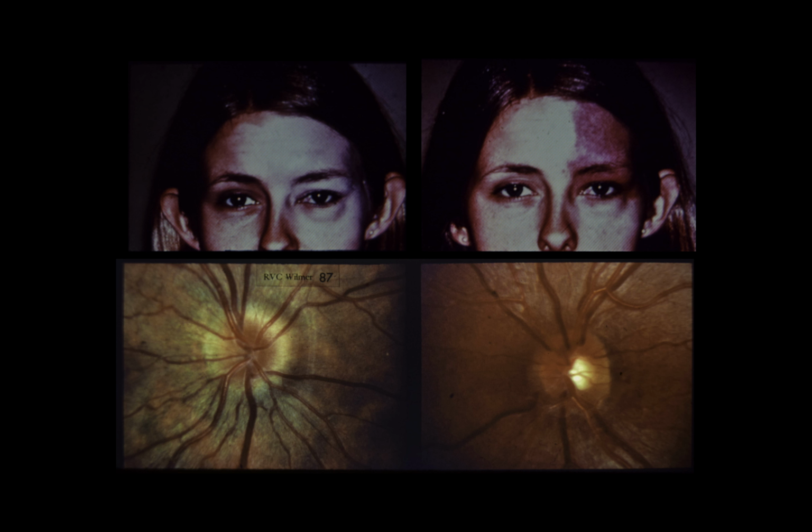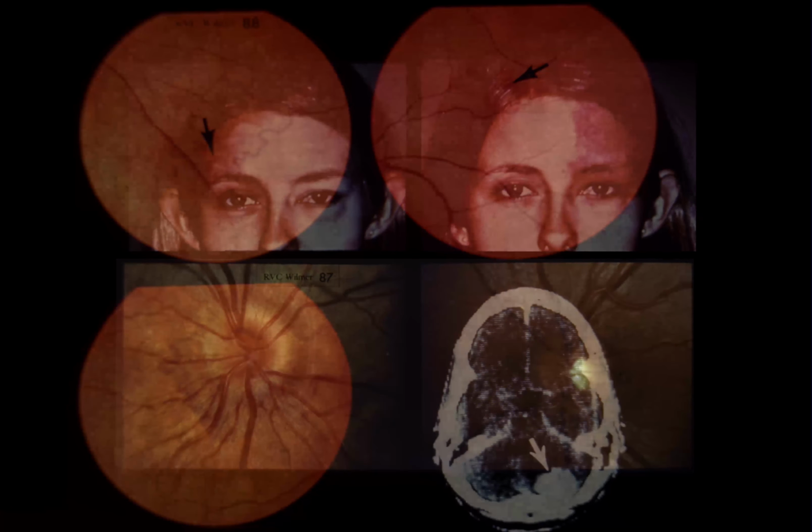Both of these eyes may contain angiomatous lesions associated with the Sturge-Weber syndrome. The right eye probably has some type of intrinsic optic disc angioma, while the reddish appearance of the fundus in the left eye is almost certainly due to a diffuse choroidal hemangioma.